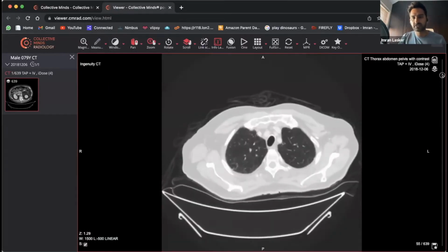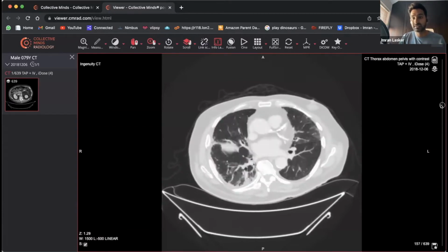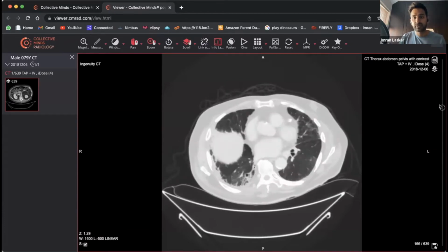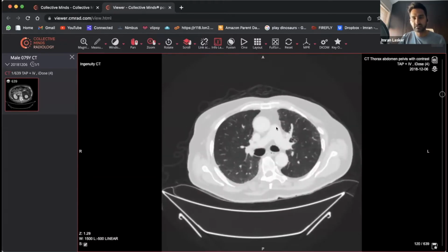And they've got abdominal pain. So one of the things may be, have they got air under the hemidiaphragms, or they may have pneumomediastinum or something like that. But as you scroll through, there's nothing like that. If you look at the mediastinum, which is this area over here, that actually looks okay. It doesn't look like there's anything going on there at all.